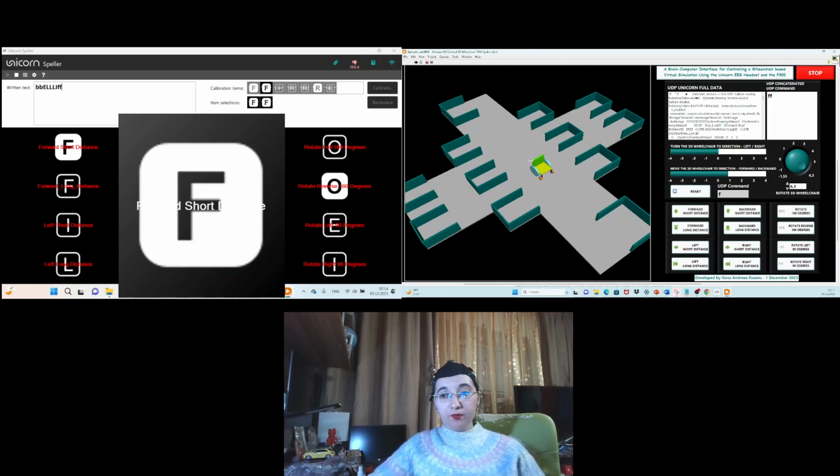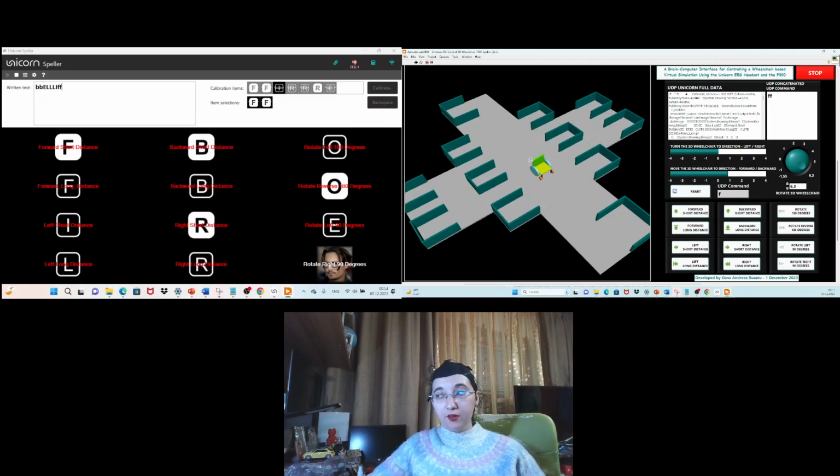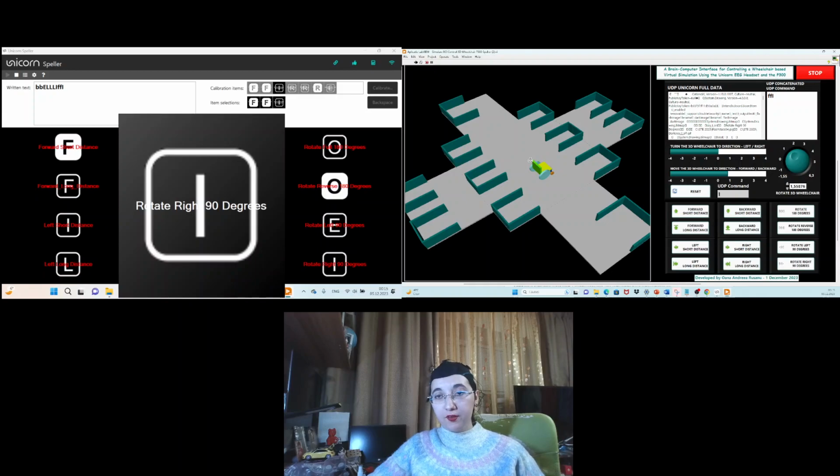Then rotate right 90 degrees. Magnificent.